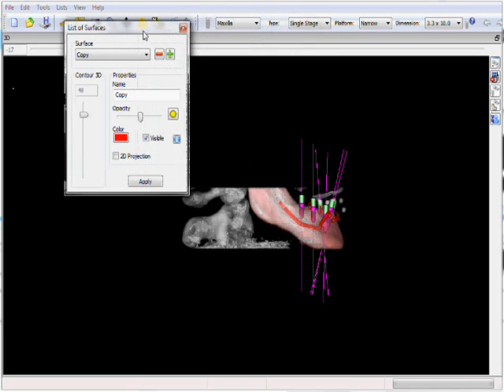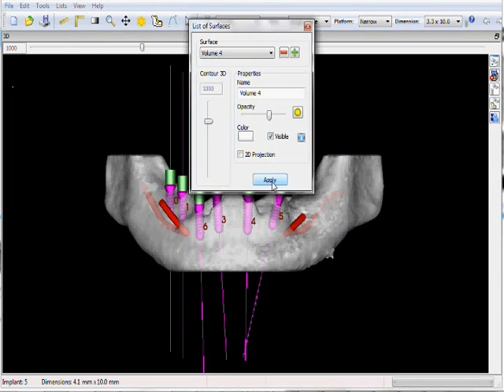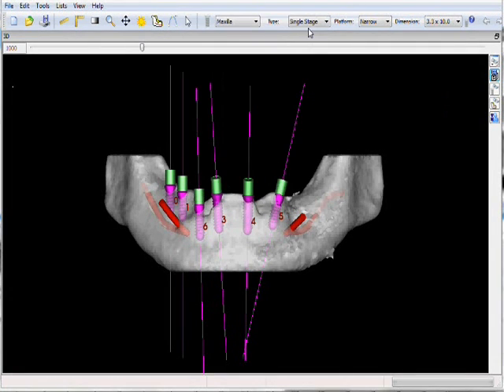Here we see that a previously cut image in the color red is overlaid with our original patient's skin. Or of course we could turn on our scan appliance to visualize the patient's scan along with the scan appliance. This concludes our 3D Connect and our 3D Cut training tutorial.